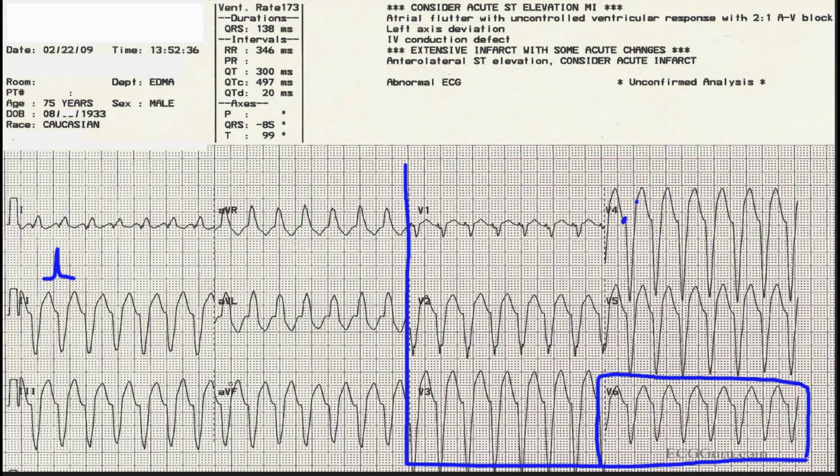A normal heart will depolarize toward the floor. This heart is depolarizing completely backward, away from the floor, away from the foot. And we can confirm that by looking at the 2 shoulder leads, AVR from the right arm and AVL from the left arm. These both come from the shoulders and look down at the heart. In this case, AVR is strongly positive. That's completely abnormal. That would never happen in a normal rhythm.